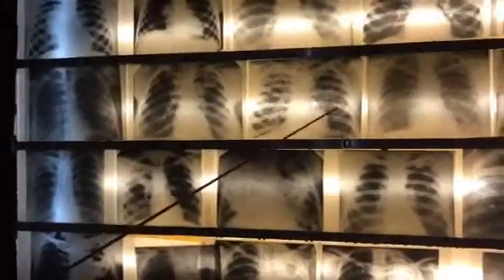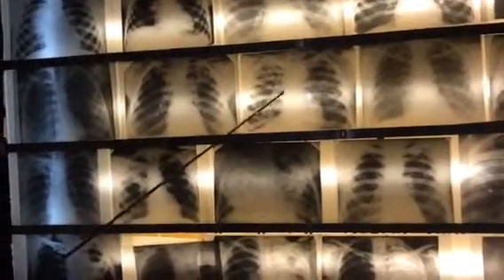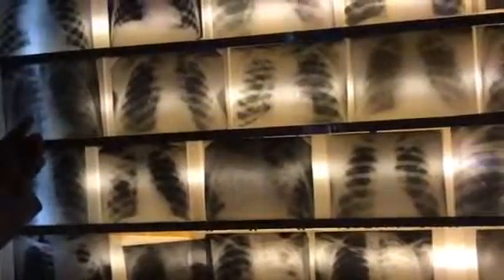On this X-ray, what do you see? What's wrong? You see the syndrome of dissemination, the same, but foggy, more and bigger. Yes, the syndrome of snowflake. Subacute disseminated tuberculosis. For this, you see the syndrome of star sky. You see all the foggy.